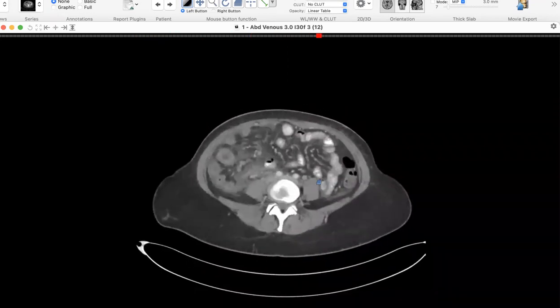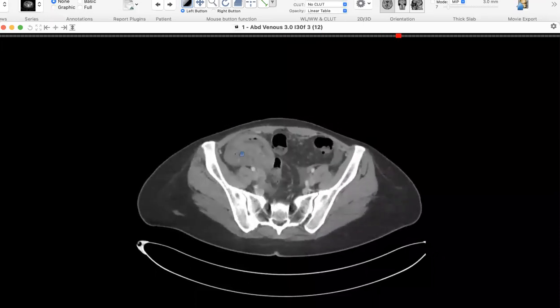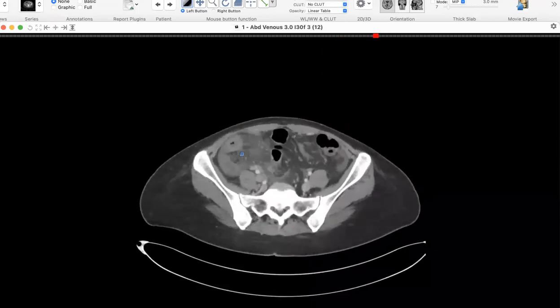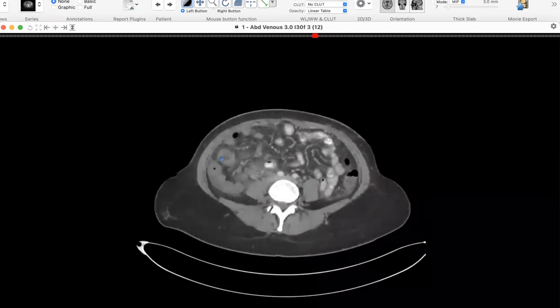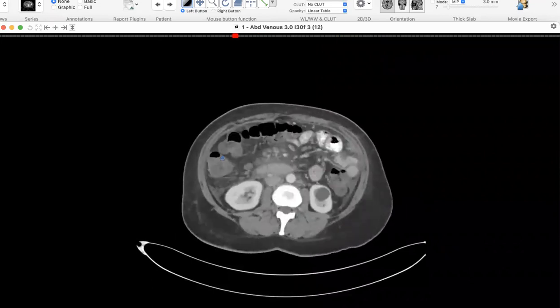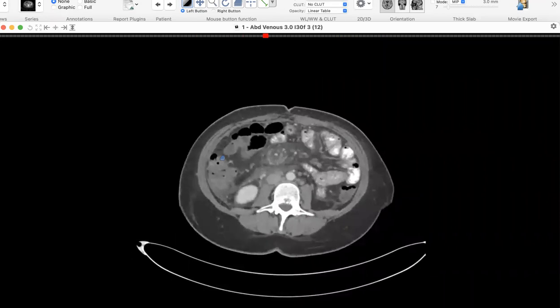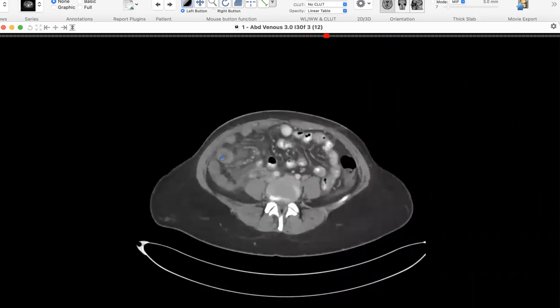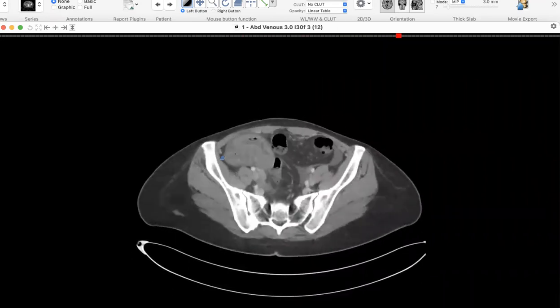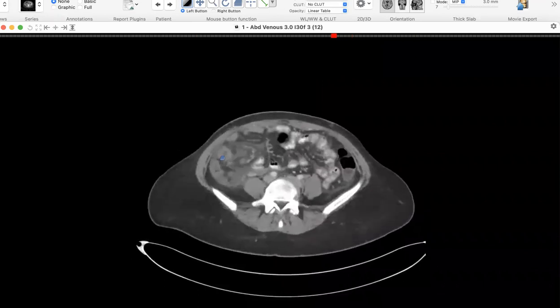It is less than this in the right iliac fossa. However, it would raise the possibility of skip lesions. So Crohn's disease will be my first possibility. Any other differential? Other differentials would include infectious processes like ileitis, TB. Lymphoma is less likely because no obvious mass could be detected, and no lymph nodes could be detected.